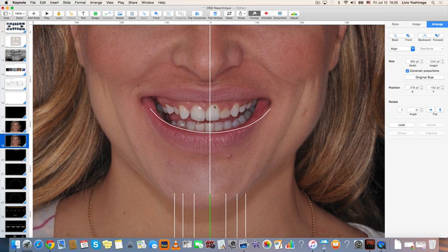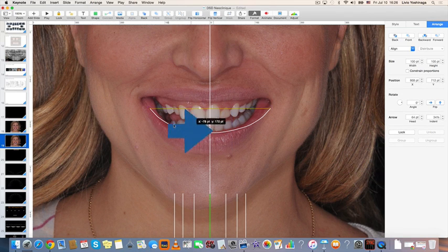So I can see here that the midline of the face is on top of the 21. For this exercise purpose, when the discrepancy is very small like this, we do not shift. But unless the patient tells you this disturbs them, we have to maintain this. For Raquel, we're going to adjust the image, and we're saying we're not going to shift the midline. So I'm going to adjust. I'm going to click here. Let's just do what we've done on the exercise here. I'm going to leave this slide showing that there is a shift.